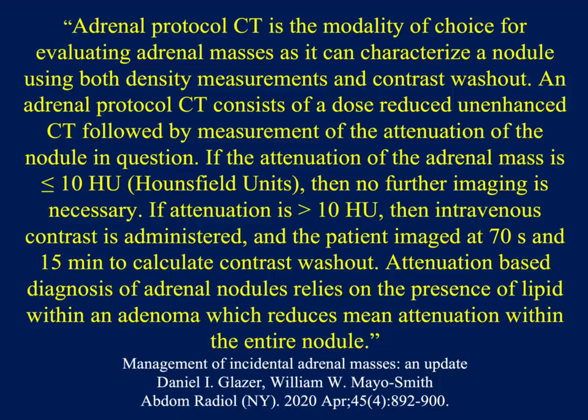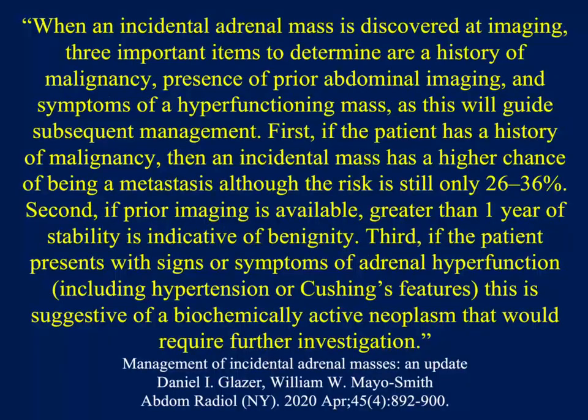An Adrenal Protocol CT consists of a non-contrast scan followed by, if the lesion is over 10 Hounsfield units, then injection of IV contrast, typically 100 to 110 cc's of Omnipaque 350, and then image at 60 to 70 seconds and 15 minutes to calculate washout value. And that's a very, very accurate process, again, remembering some of the pitfalls of washout values.